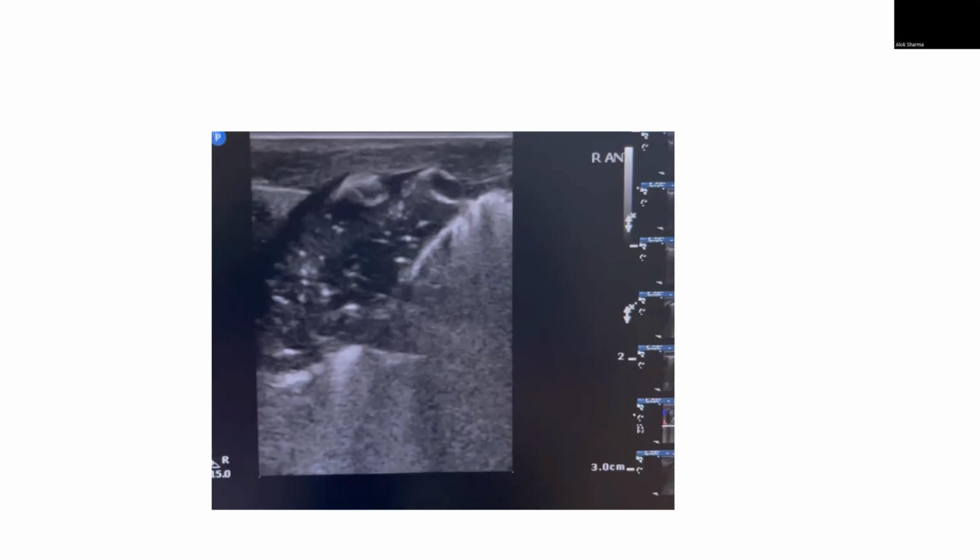So definitely a consolidation, maybe an element of atelectasis with it. You've got static bronchograms. The possibility that he's aspirated, from what you're saying, is very high. Exactly. And that's what my colleague over the weekend was thinking about as well.